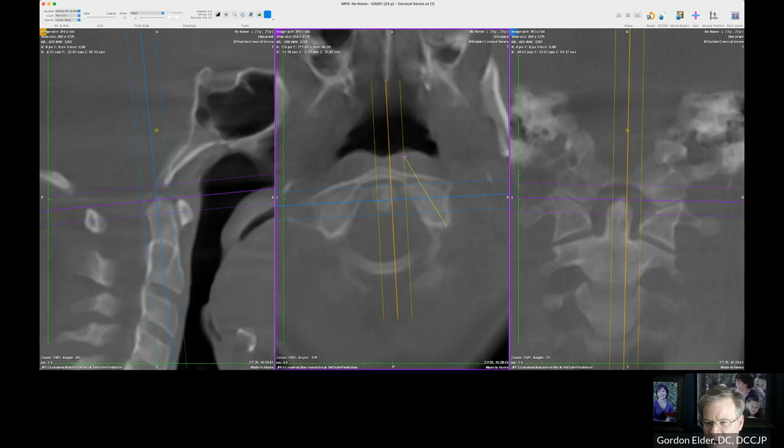and then eyeball bisect the joint, typically the front of it ends up right in here somewhere. Boom, and I've got my right convergence angle. Now, once I move away, that's going to disappear. I will take a picture of it so I can come back to it when I want to actually look at the joints. I'm going to mark it with these points that will not go away in 3D. And there's my convergence angle. I hover over this, hit shift, I got both.